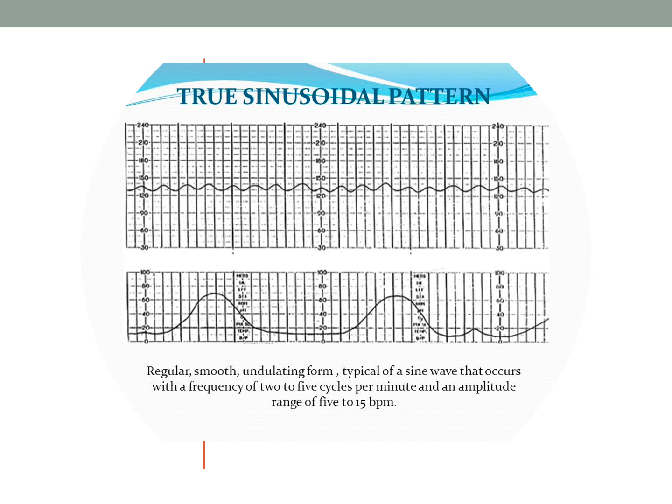Are you going to wait for 20 minutes to intervene? Absolutely not. The minute you see 1 or 2 minutes of this, you're concerned. You need to be performing interventions and making sure that you break that pattern. If you cannot break the sinusoidal pattern, then it is a true sinusoidal pattern and it's an emergency and the baby must be delivered.